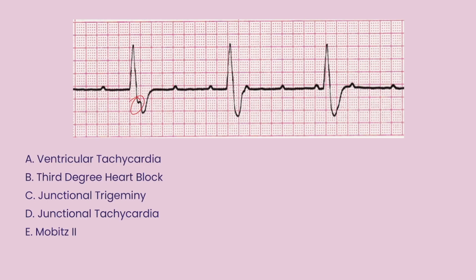All right, buried P, third degree heart block. You can investigate further for this, okay? Remember, we've got P wave, P wave, P wave, boom, boom, boom, boom. Those are regular. QRS is regular. They're wide. They're not talking to each other, and we have a buried P wave, third degree heart block every single time. If P's and Q's don't agree, then you have third degree.